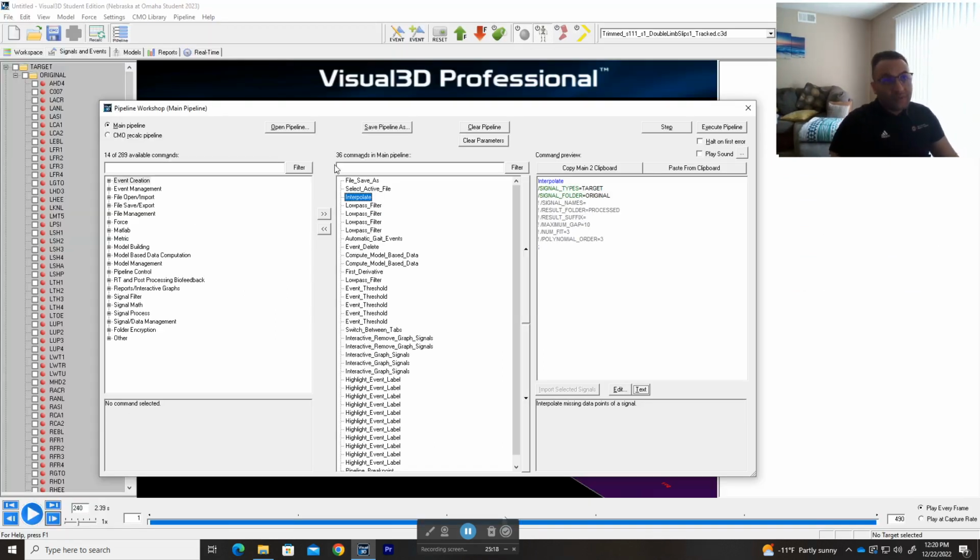So, I like to keep it there, but it's not necessary. If you did a good job processing your data in your motion capture software, then you don't need to add it here. But it's good to keep it here in case you missed something. Okay? Alright, so we have that.